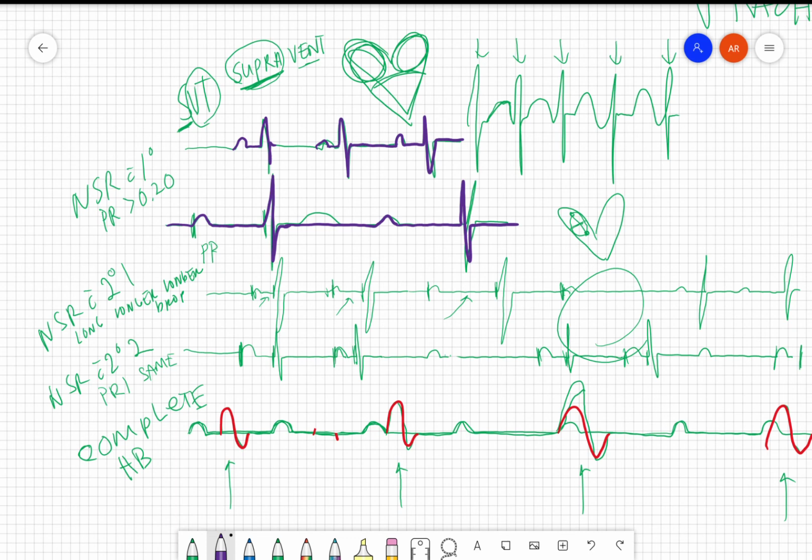So we go into our second degree type 1. She'll say, "Take out the trash." He takes it out pretty quickly, and then she says, "Take out the trash," and he waits a little bit longer, and then even longer. Maybe they've had a discussion about it, "I don't want to take out the trash," and it takes longer and longer. And then finally he's like, "You know what? I'm not going to take out the trash. You can take it out yourself."